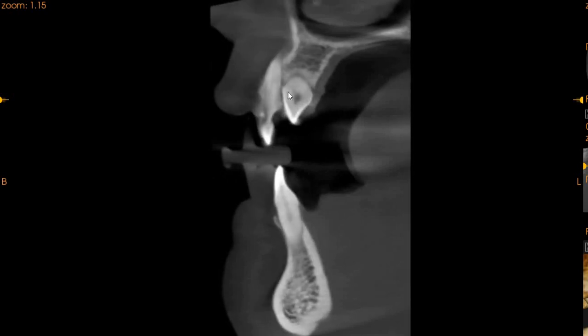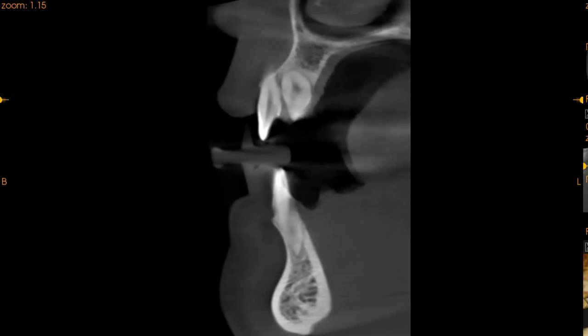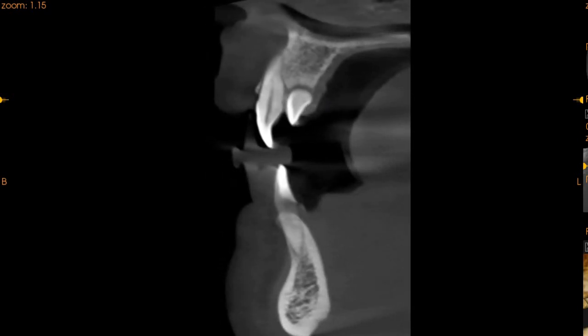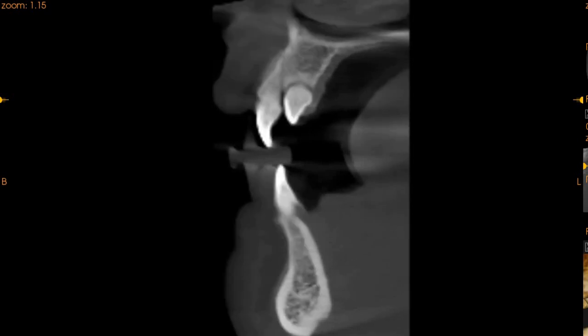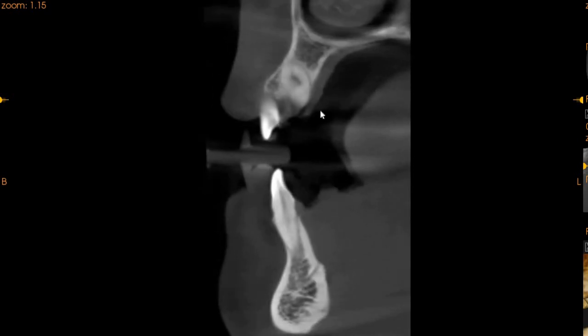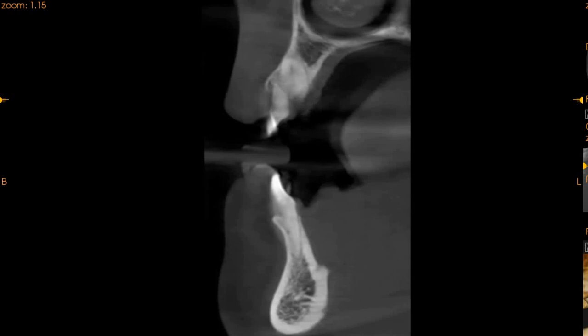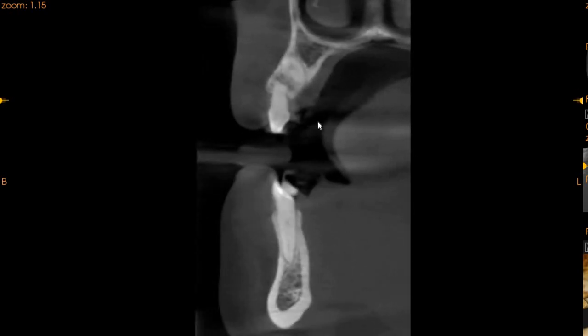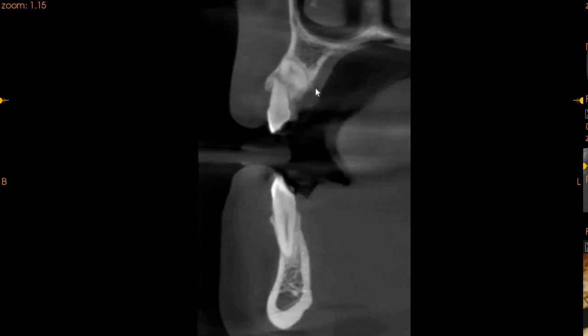This is where the lateral incisor is. We can see how closely associated this is. It is not in contact with the central, but it is also very closely associated. But the deciduous canine also, there we go. So this is the deciduous canine, and we can clearly see the roots have been resorbed, and the apical one third of the roots of the permanent canine is definitely in contact with the roots of the deciduous.